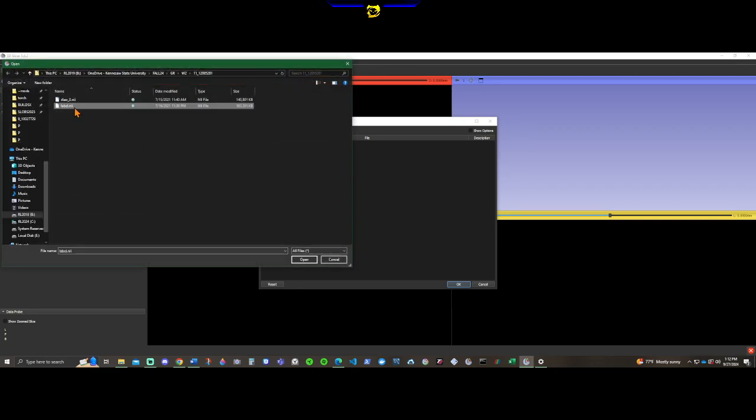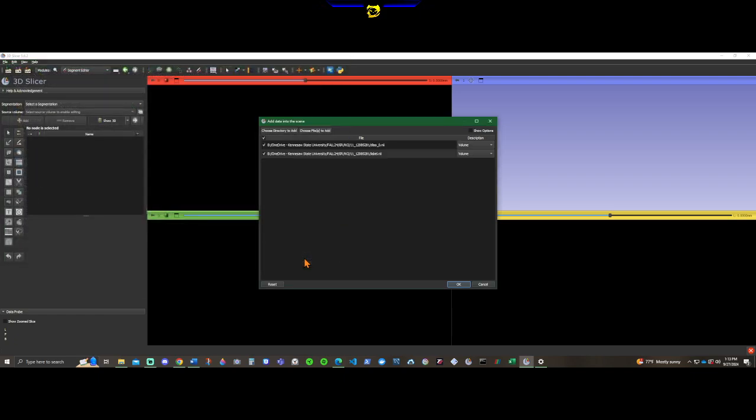So I've already put them in a separate folder, and I labeled it as 11 with the number itself because it's faster to label it as 11 compared to the 1208 5281 and remembering those numbers. So I'll just be using 11 to keep track of how many I've done, and so on and so forth. But without further ado, you pull them both in.